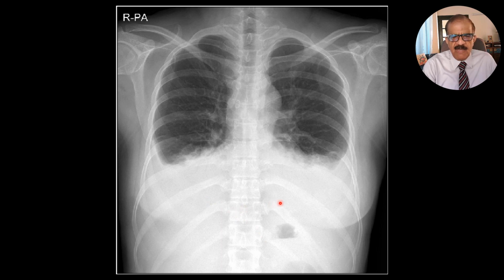It's the same bilateral pleural effusion, but this one is slightly bigger. And there is another observation also. See, there is bilateral obliteration of the costophrenic angle. You don't see the diaphragm on either side. You don't see the cardiophrenic angle on either side. You don't actually see the normal heart, because both right and left cardiac borders are obliterated by the effusion.